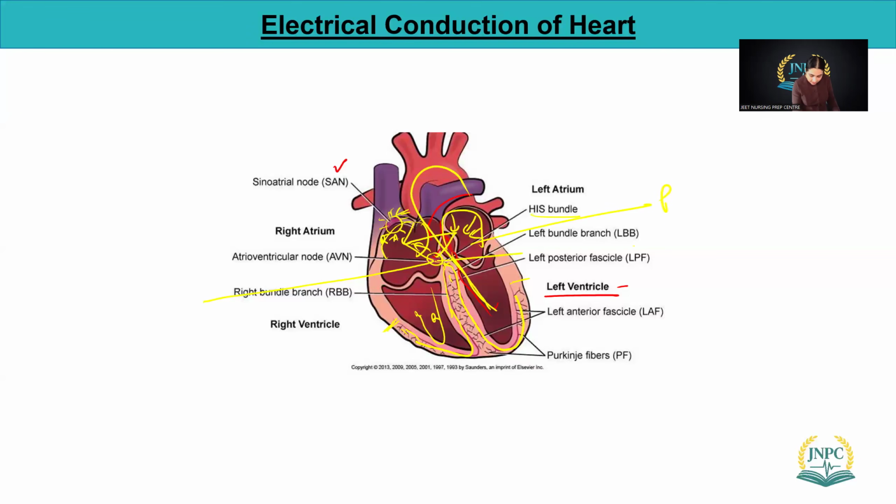When it was coming at the septum area, that point Q was forming. And now this is the R wave. When the impulse travels through those bundle branches, look at how much area it has to cover. A lot of area. So that time your R wave is forming, which is the major one, right? Q, slight deflection, and then positive inflection in that rhythm. So that time our R wave is forming when the pulse is traveling down.